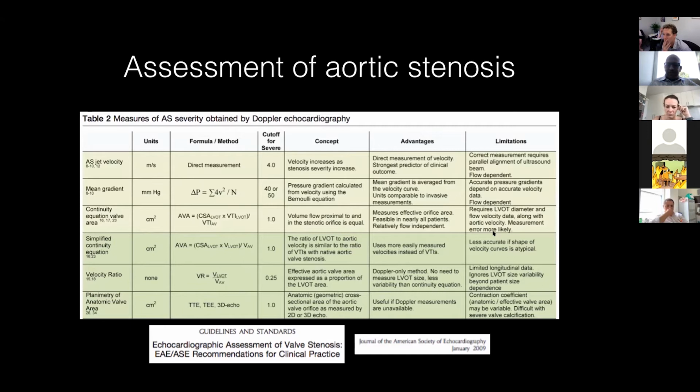Yeah. Sam, quick question. Is there any influence by the sample volume when we gate it? No, so the sample volume is classically about maybe 8 millimeters. The smaller you have your sample volume, I guess the more accurate the blood flow going through there is, but the more prone it can be to error from angle. The classic one, I think, that Benita Anderson puts in her article is to say that we should be between 5 to 8 millimeters. And I do whatever Benita tells me. Okay. As we all should.